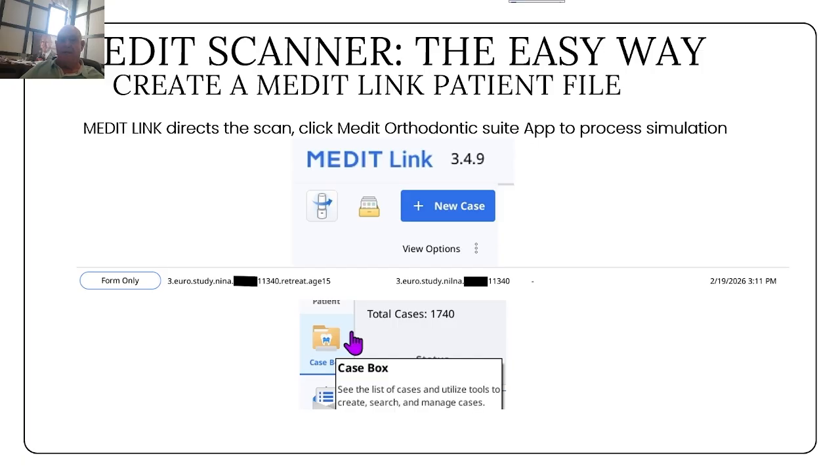Every so often you'll have to update that. It's a free update. They do now have a price for storage in the cloud of all your scanned data, but it's a very small amount.